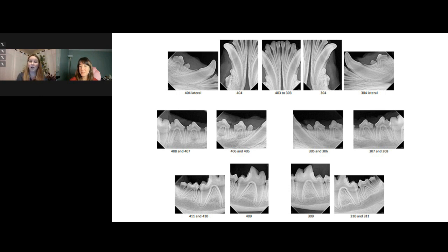But if you are in that mouth early and you find an unerupted tooth, it is very possible that it is going to turn into a dentigerous cyst. In the worst situations, dentigerous cysts become very large and can result in mandibulectomies. I also had one case where bilateral dentigerous cysts went through a morphing phase and actually became squamous cell carcinoma.